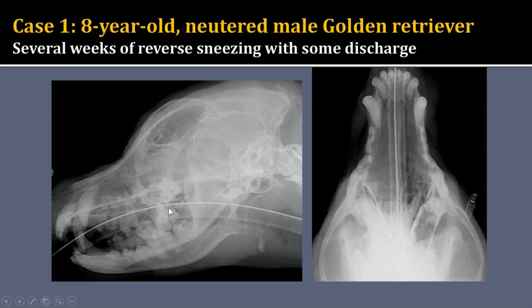On the lateral view that's oblique, it's going to be a little bit challenging to evaluate that nasopharynx that I always talk about having you guys evaluate. It's also going to be a little bit challenging to evaluate the nasal passages, which would be normally superimposed anyway, but now there's more artifact of positioning. However, I do see that the frontal sinus has probably true increased soft tissue opacity because this is typically a fairly lucent region. So the main findings that I see of this kind of soft tissue mass with associated regional marked lysis is going to be most consistent with destructive rhinitis.